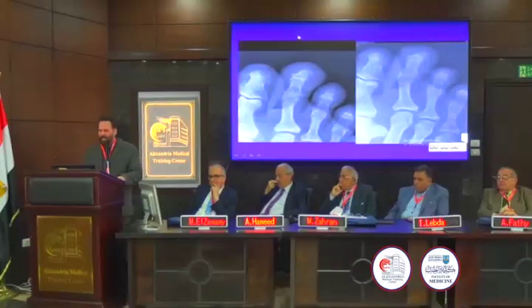8 days apart, we see an ulcer in the soft tissues of the toe, some early destruction of the tuft, and then within 8 days the tuft is mostly destroyed. Another one, early destruction, really soft tissue swelling and an ulcer only, and now you see the bone destruction.